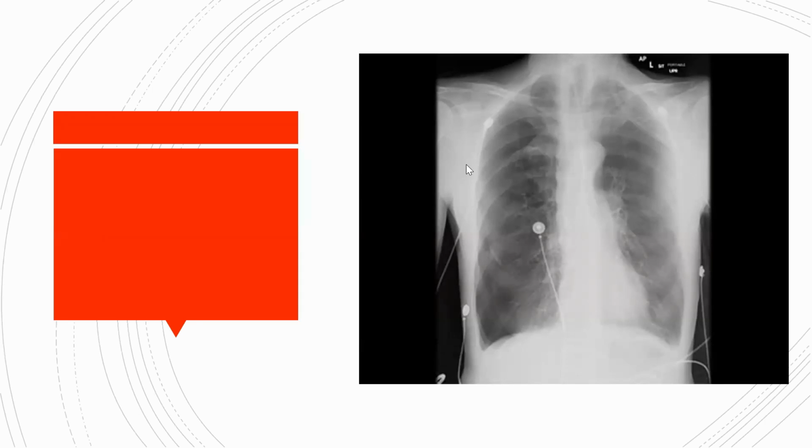Okay, so actually the aorta looks fine. There's a very nice aortic window. It doesn't look like a triangle. It looks like a crescent almost. But you guys haven't seen the pneumothorax here. Can you see it? Can you see my mouse? You can, right? So can you see on the right side, there's a small area at the bottom in the costophrenic angle where there's no markings. And then very sly, you can see the lung border right here. Okay, are you guys happy that you're seeing the pneumothorax? You guys can't see my mouse, right? Oh my God, now I'm having doubts.